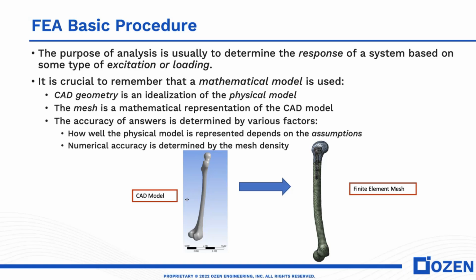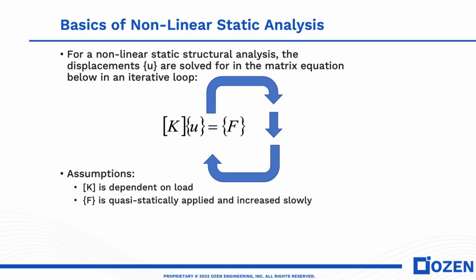And as you know, when you do a finite element analysis, you take that data, the solid model, and mesh it. Then you do mesh convergence studies to make sure that you're getting the right stresses and the right fatigue calculations out of your model.